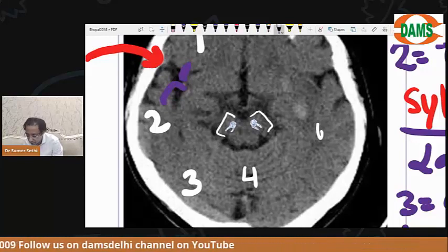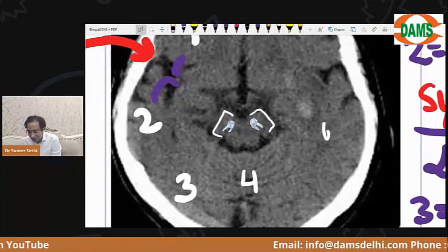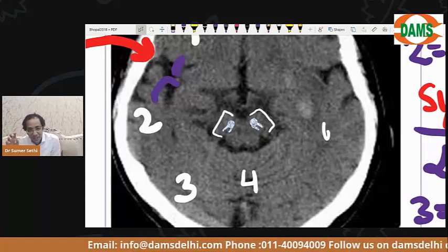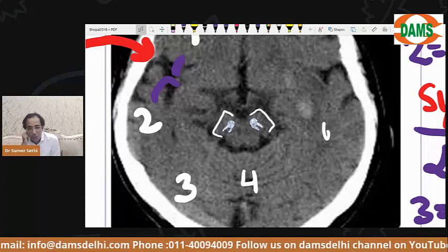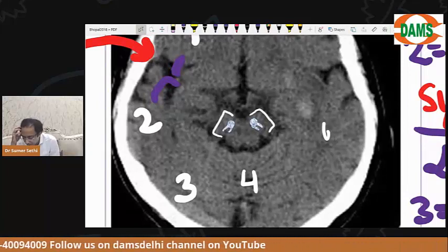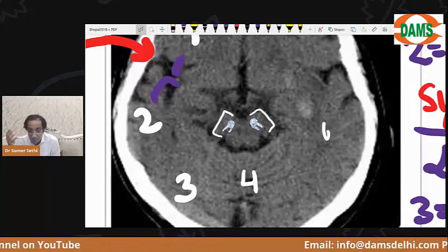Okay, this is where you have the substantia nigra. Okay, Rachana is funny. Anybody, substantia nigra. Name the disease that I'm trying to tell you here. Which disease is associated with that structure that I made for you? Okay, that is Parkinson's.